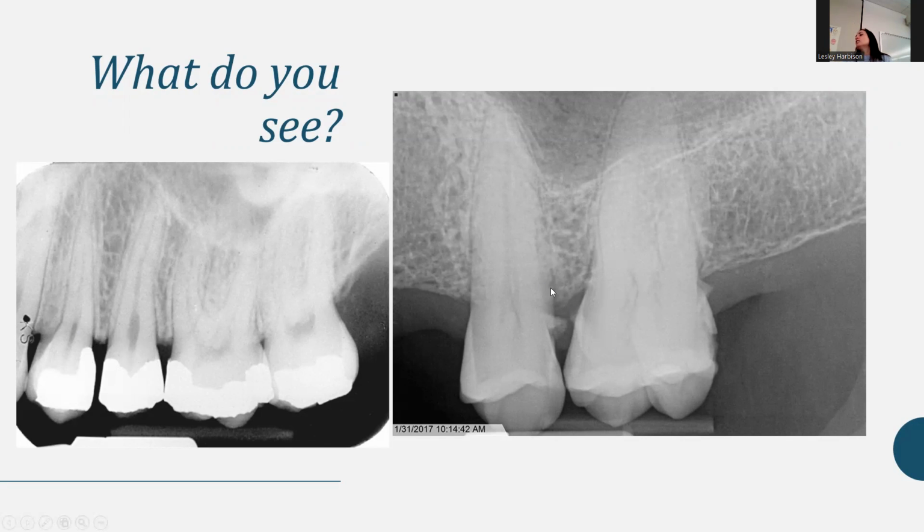Here on this side, we can see we got some bone loss started there, localized factors, calculus. You guys all can see the calculus pretty easy, huh? Anyone having any trouble at all? Like once you see it, you can't unsee it. It's like, I just see calculus everywhere. It gets exciting. Okay.